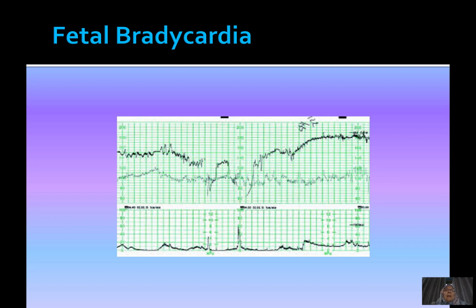And then you see a recovery of the baseline rate, and there seems to be a compensation of this baby. At first, the recovery is to a fetal tachycardia, so it would need to be seen what happens in the CTG later to see how this goes on.